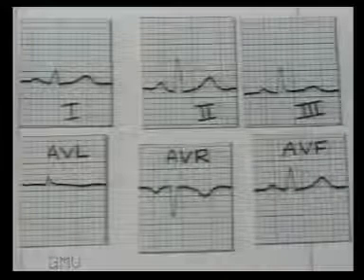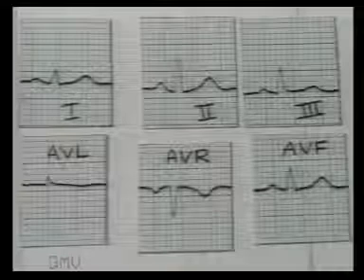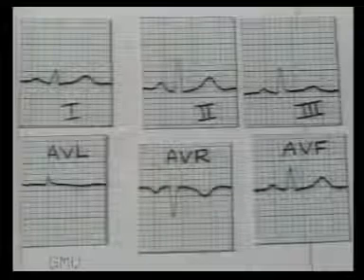A Q wave deeper than 1 millimeter or wider than 1 millimeter or more than 1/3 of the R wave is considered as significant.